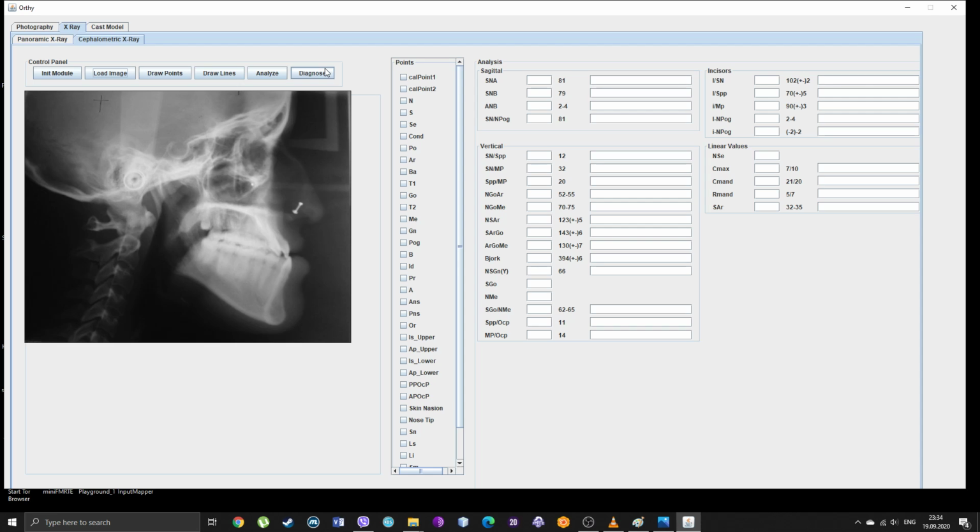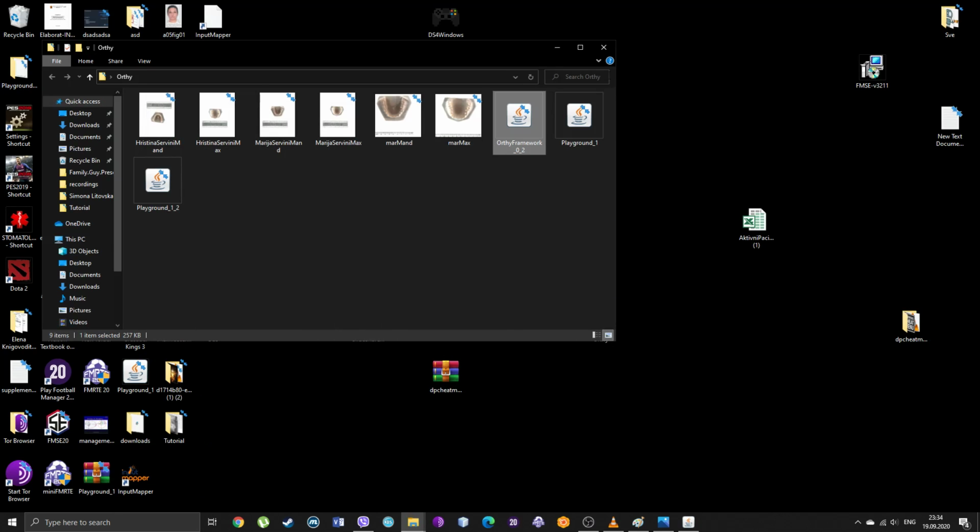Just save it somewhere and you have it, or you don't have to save it. You just have the results here, and it is what it is. It's not perfect, but it's nice, it's useful. That's the short introduction of my program.